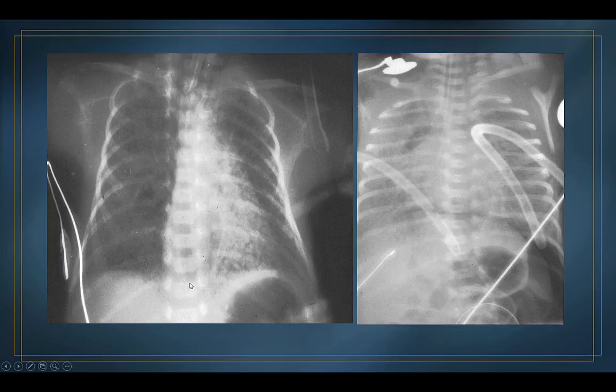This is a posterior pneumomediastinum. And although this is a different patient, he also has that sort of oval lucency that comes to a point. That's also air in the posterior mediastinum, and air in the posterior mediastinum can dissect into the retroperitoneum and very quickly rupture into the peritoneal cavity, and so you can have a pneumoperitoneum that's benign and unrelated to a perforated viscus. If you have a sick baby that also happens to look like they may have a GI disease, it may be hard to differentiate the two.